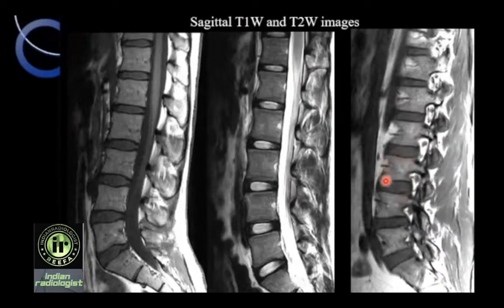What we see here is vertebral body, pedicle, superior articular process, inferior articular process, which is actually better seen here. This keyhole-like thing is the neural foramen through which the exiting nerve root is coming out. We're going to talk about that in detail a little later. This is pars interarticularis, which is the neck of the Scotty dog. And here if you see, it's broken. So this patient has spondylolysis of L5 vertebra without listhesis.